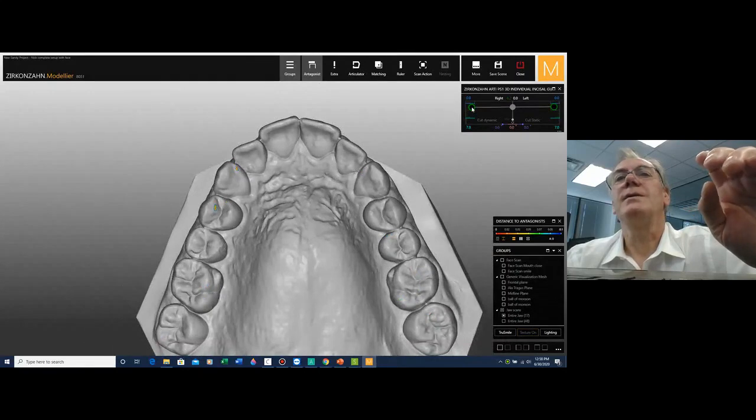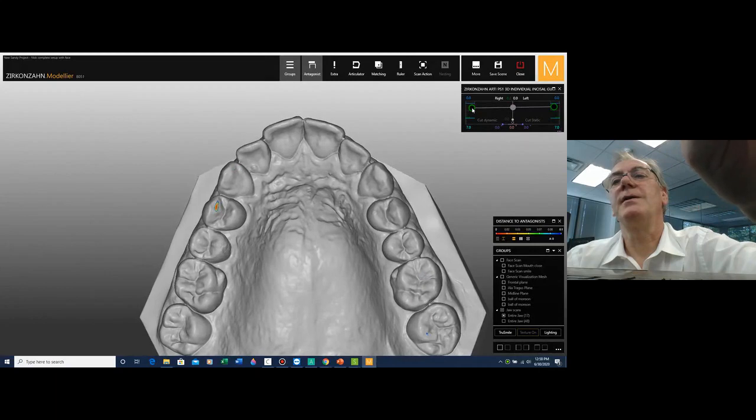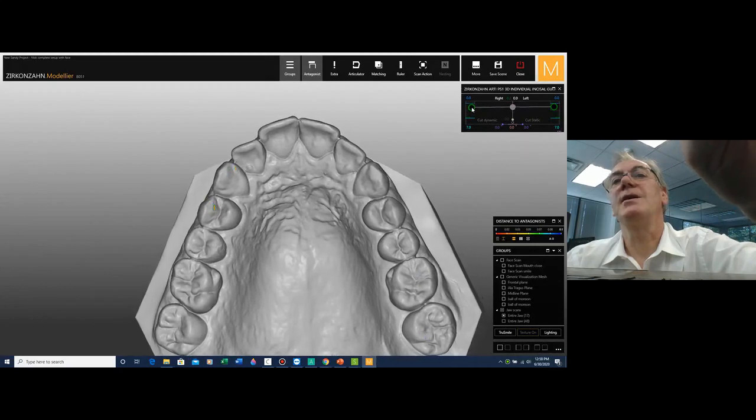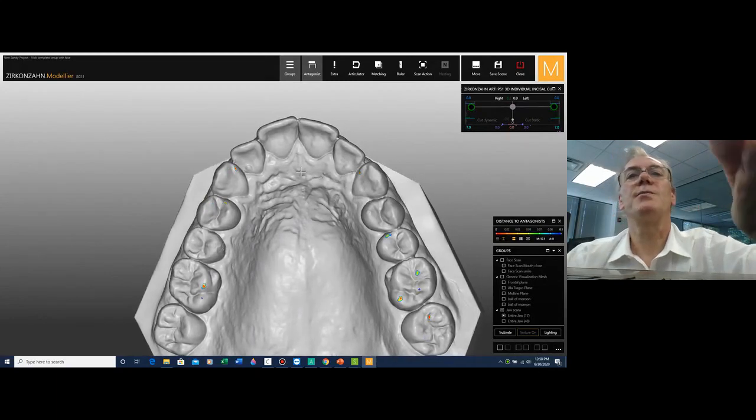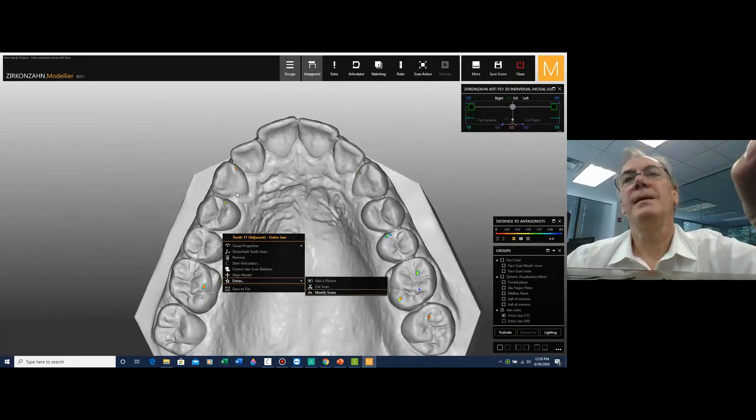There again, we go 1, 2, it's only touching on the premolar, still holding up the load, and then it just touches something down there. So we still need to work a little bit on this premolar. Let's take it down. Let's take it down all the way, modify, scan. I'm really curious to see how that canine is going to take the load. So I'm going to go all the way to the end.